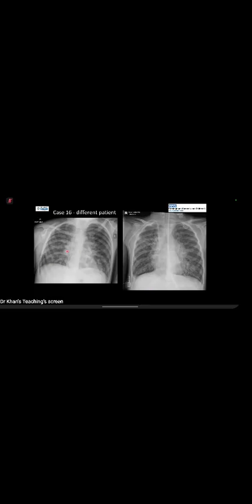So you would see radiating bronchial wall thickening from the hila towards the periphery. These patients would have a central line in because they are usually treated with long-term antibiotic treatment. This is when they present with acute exacerbations. You can see there's bronchiectasis, tubular markings. You can see them as linear or rounded lucencies with wall thickening.